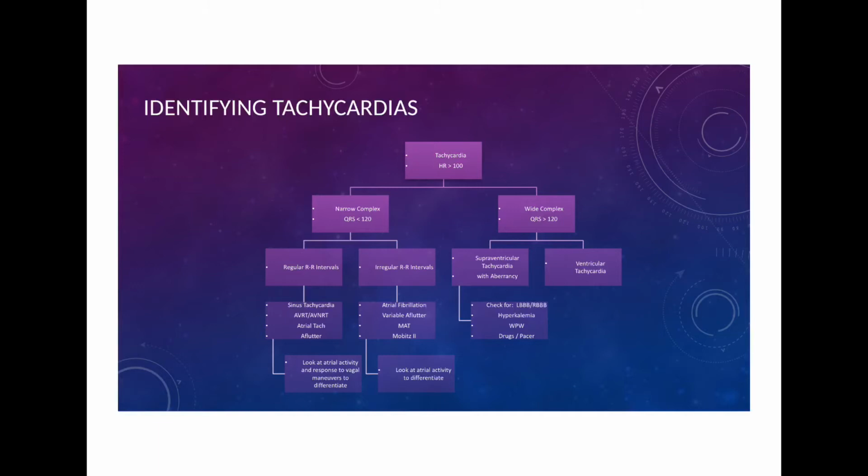Now let's say you perform an ECG on a patient because they're having palpitations, or you notice that their heart rate is elevated. So you'll order an ECG, you'll go up and see the patient, and when you arrive, the nurse will hand you the ECG and ask you to figure out what's going on. So you look and you'll see, first of all, that the patient actually is having a tachycardic rhythm. The rate is more than 100, so QRSs are appearing on the whole closer to each other than 3 big boxes. The next question you're going to ask is, is the QRS generally looking wide or narrow?